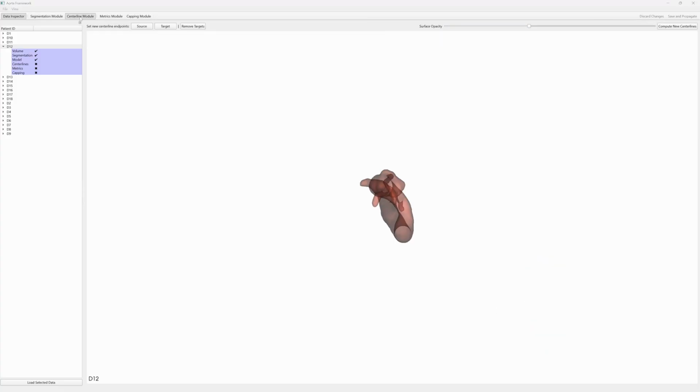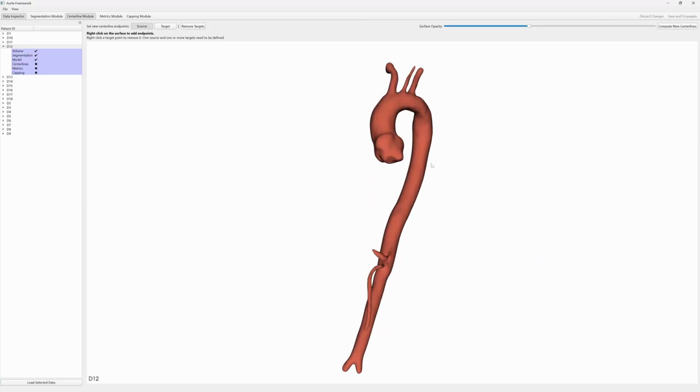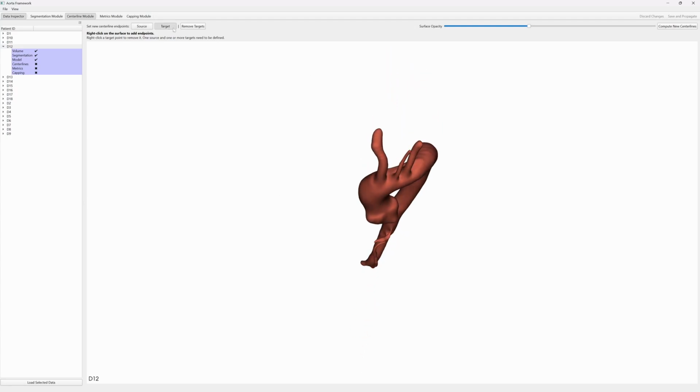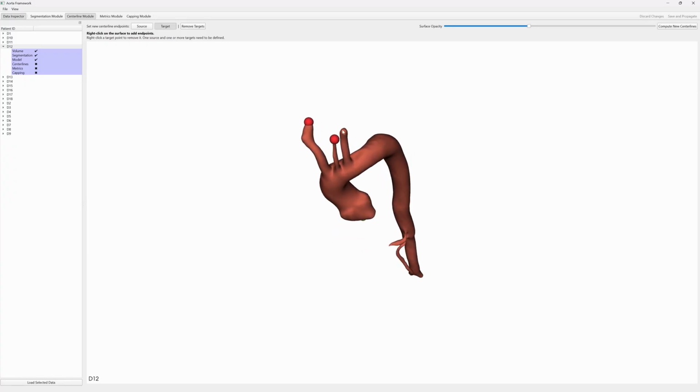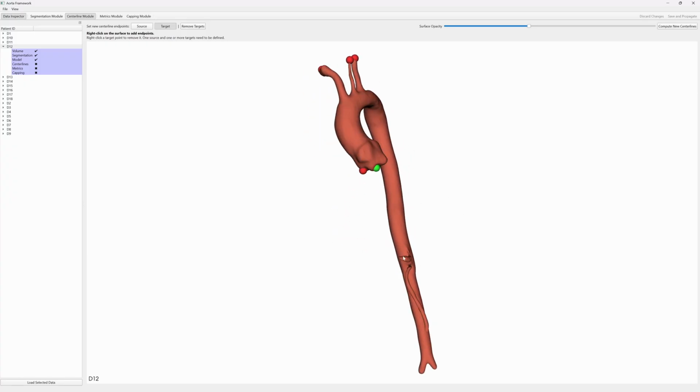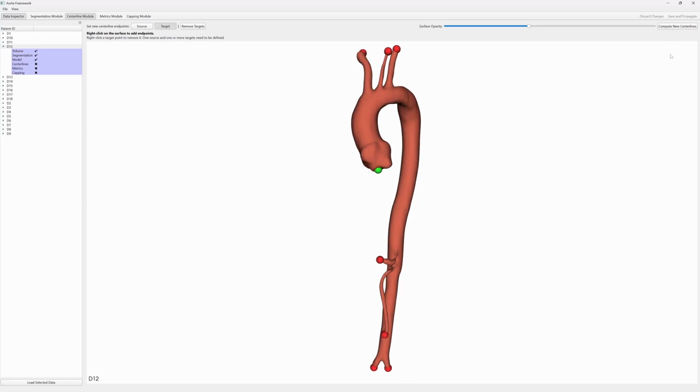To determine the internal radius of the vessel and to get a topological representation, the centerline computation of the vascular modeling toolkit is integrated into the framework. The calculation requires the user to specify the approximate start points at the aortic root and the approximate endpoints of the centerline at the end of the branches. Branches of interest and branches to be omitted can be specified this way. For easier selection of the source and target points, the opacity of the surface can be altered.